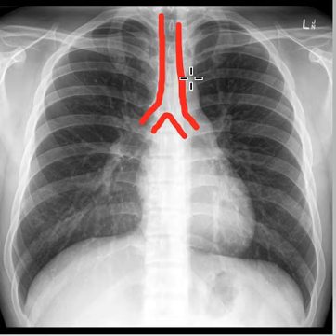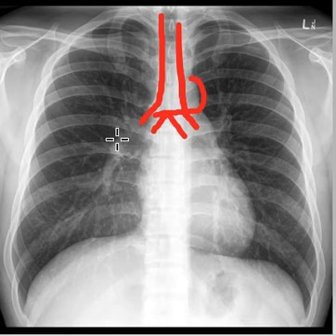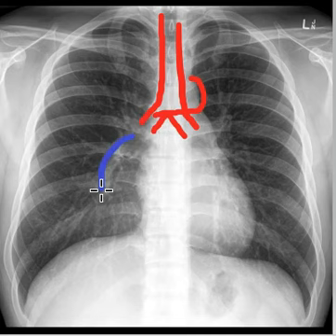On the left side, you can see this knob, this knuckle. This is basically the aortic knuckle, and the lower border of this aortic knuckle coincides with the bifurcation of the trachea. On both sides of the heart, you can see these vessels, and the area where these vessels are coming from is known as the hilum of the lungs. Now you can see these vessels going up and down.